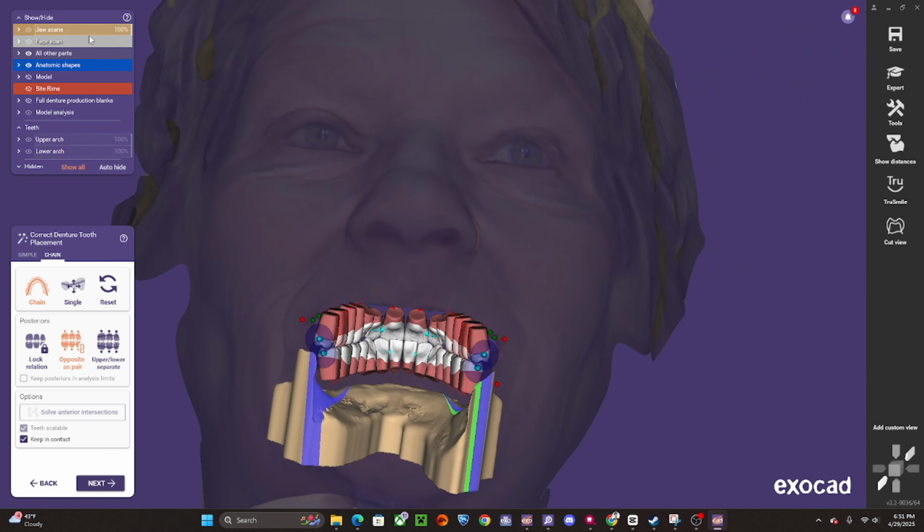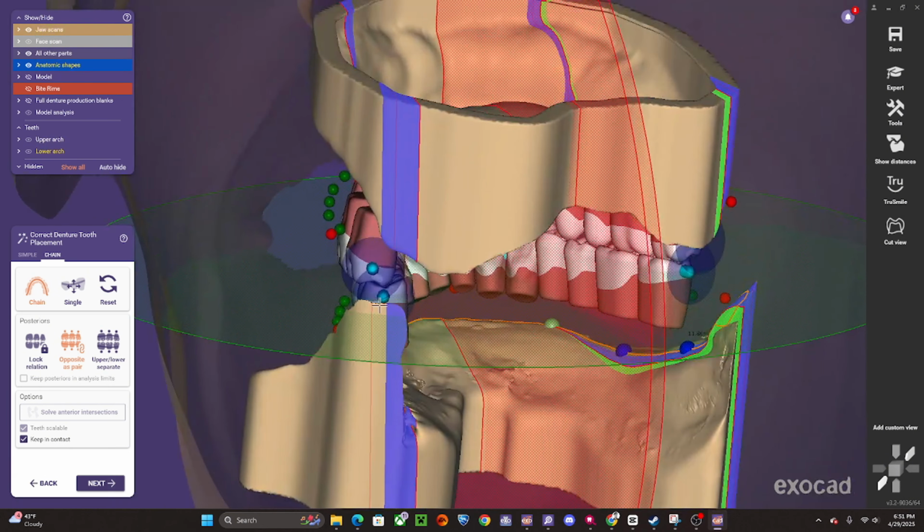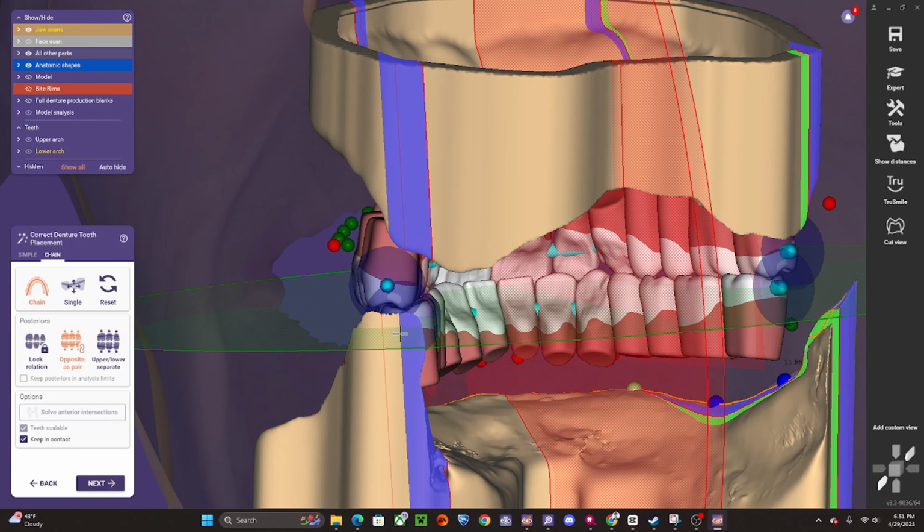Now, if I need to pull this buccal corridor out on this patient's left side, for example, especially down here, I'm going to go change my view to this posterior type view, and I'm going to grab this distal disc. Now, once I grab this distal disc, what it's going to do is move our upper and lower molds at the same time in that perfect class 1 occlusion type that was set when these teeth molds were scanned in and waxed.